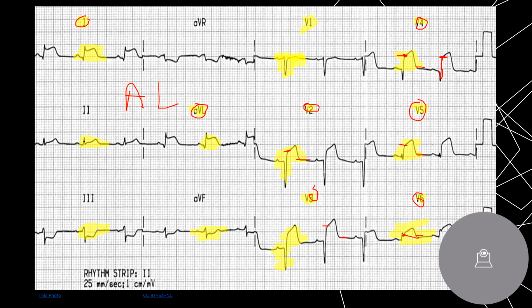Again, honestly, to see just a septal MI is very rare because the septum is mainly just little feeder arteries that are fed off of the anterior. So anterior and septum, they usually go together.